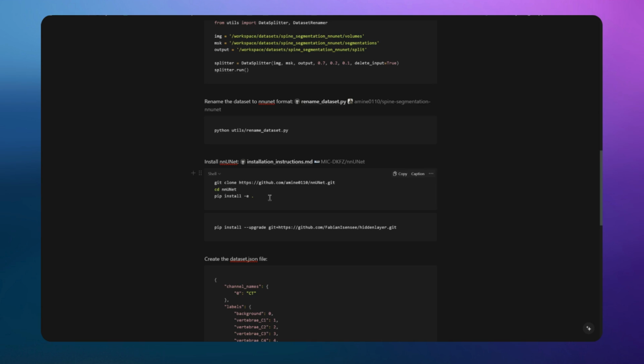So let's say you had a model trained one month ago and you want to do inference now, you cannot do that. And if, for example, you train a model now and you want to use your inference code that was built one month ago, it will not work, because there are two different ways they are exporting the model network, and they are exporting the model weight. So it is different from what we were doing one month ago.